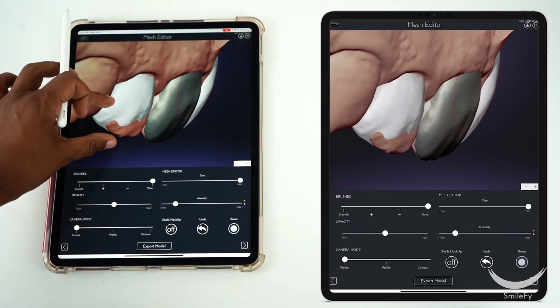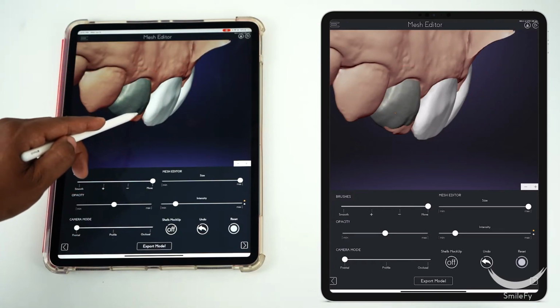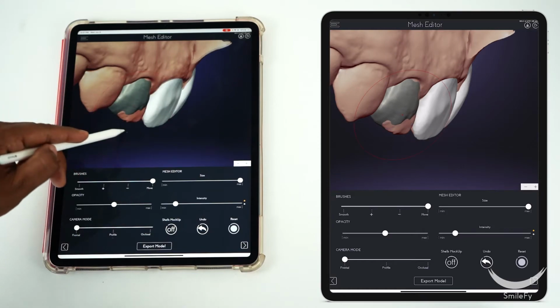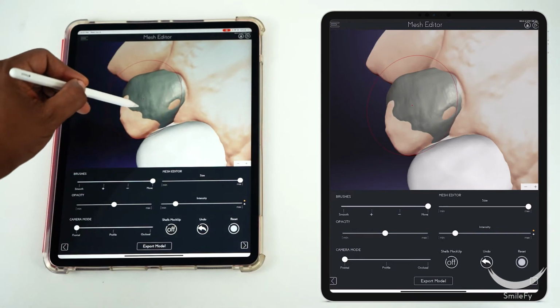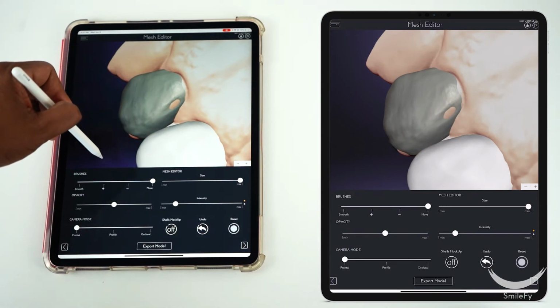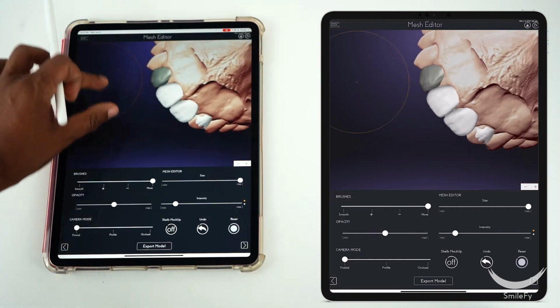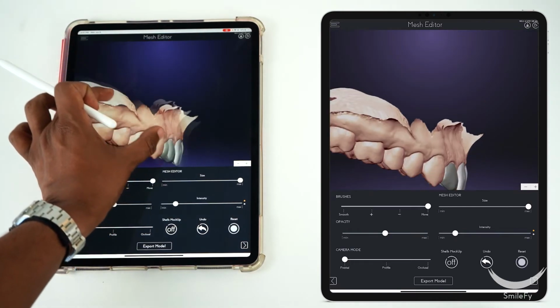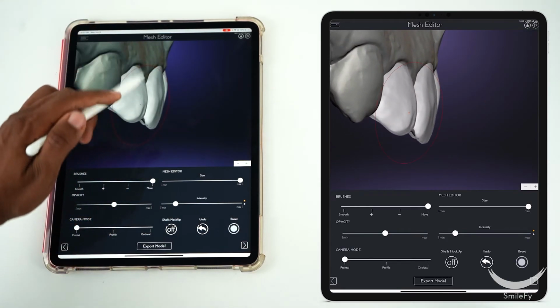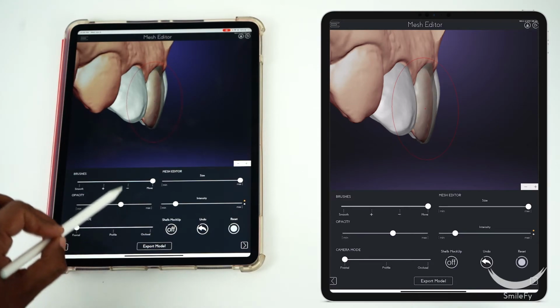Let's make it a little bigger. Make sure that you're not creating a very bulky 3D design. So whenever you can, just turn the STL towards like if it were in a profile view, and check the thickness by changing the opacity of it.